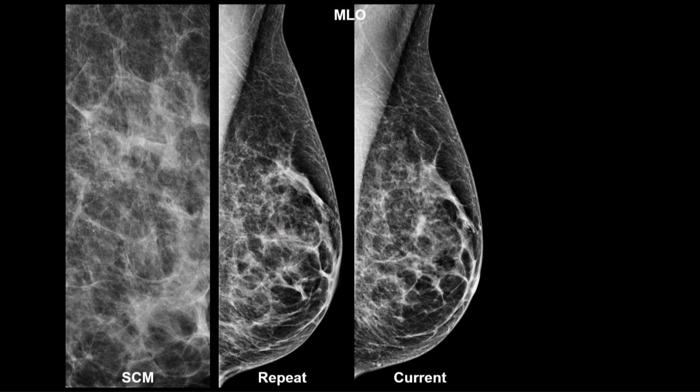On the spot mag, you have the advantage of a much finer detail image. So if it's real, sometimes you will see it on this when you don't see it on that, just because spot mag is better. But you have to be careful that you're looking in the same location, and your landmarks may be different and may be challenging. If you're not sure you have it in the image field, you may have to take more than one spot mag, but almost always a skilled tech will be in the right place, and you will have landmarks. So, for example, this dense tissue here is this, and the dense tissue down here is this. It's going to be somewhere in the middle.